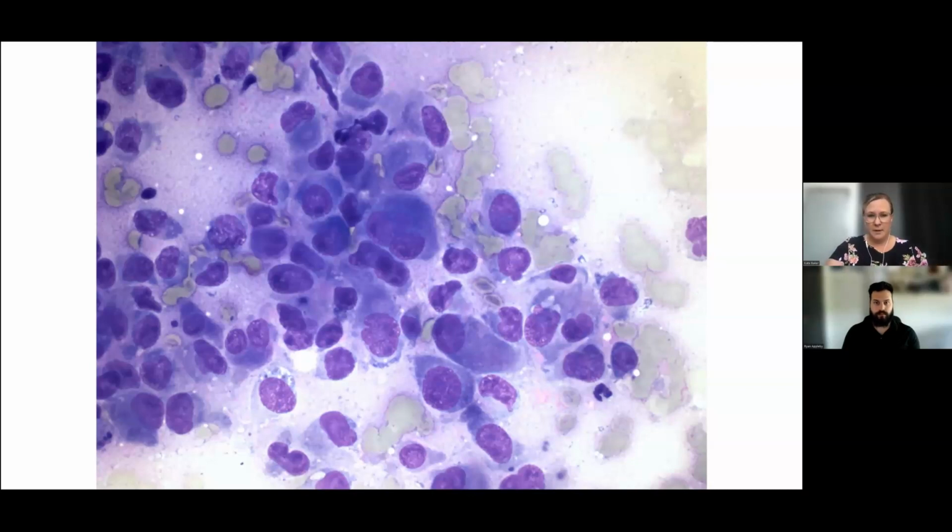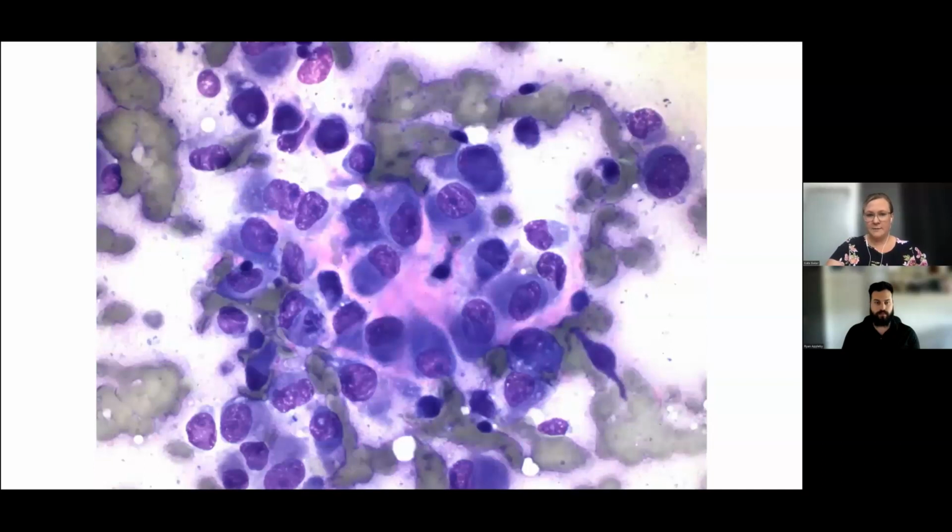These are all different types of sarcoma that can occur in bone. The thing about this population that makes me very, very suspicious for osteosarcoma in particular, there's a couple of clues here. One is that if you look at these cells again, they kind of have a plasmacytoid look to them. They almost look a little bit like plasma cells. Like if you look at them, you notice that their nuclei are off to the side, which is kind of a plasma cell-ish type appearance.